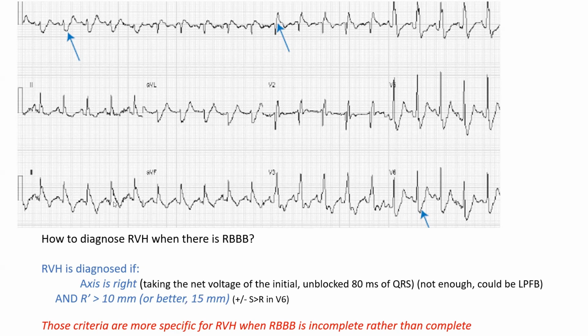This particular patient with his sinus tachycardia, this is not just conduction disease. He was coming with dyspnea and he was diagnosed with PE. He did have actually RVH on his echo that this criterion would have missed.